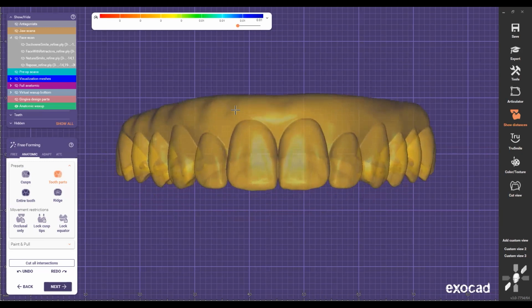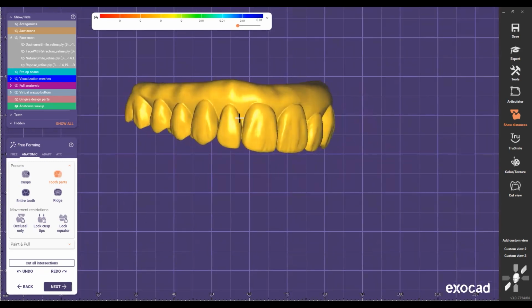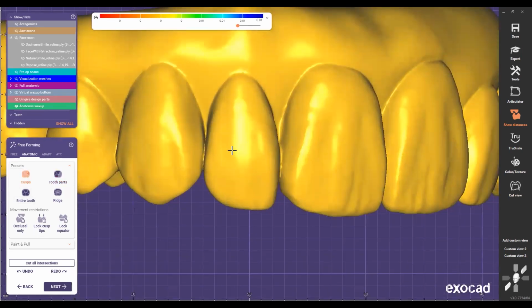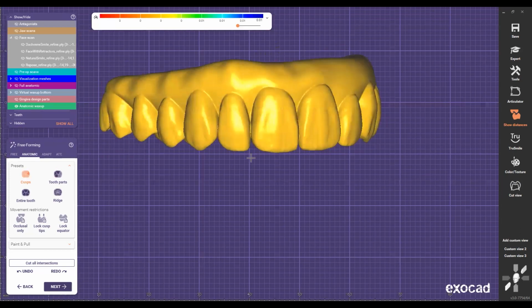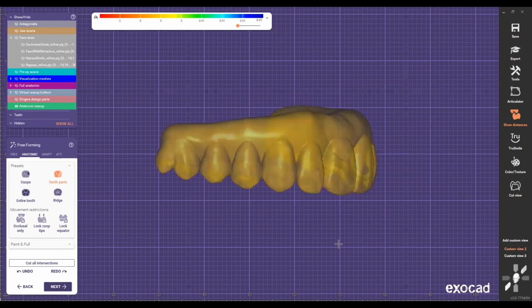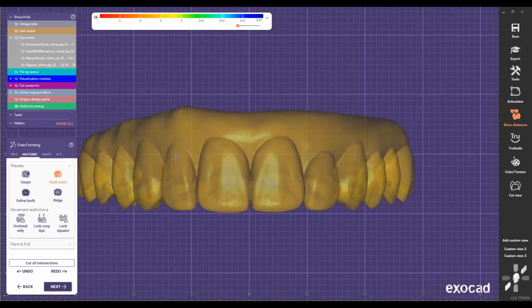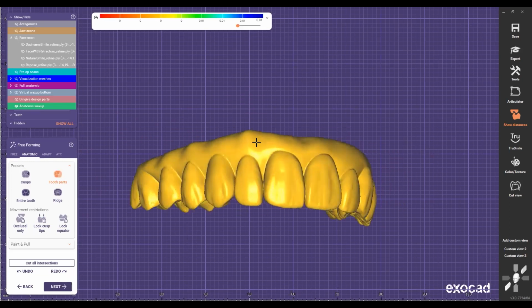Okay, so here I go, and I wanna be kind of like 0.1 to 0.5 millimeter, a little longer here. In this case, I stretch the tooth. I'm gonna try to make it look normal. Same thing here. When I go on this one, I'm gonna make sure that this cusp right here looks right when I go with the card. So I'm gonna put the card and line them up with the distal, so I can just pull this here, but I'm pulling from a surface where I don't modify the contacts or anything, okay?